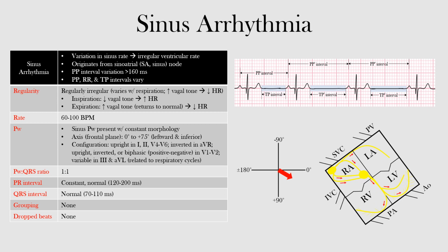conditions. Now, sinus arrhythmia is more common in young, healthy children. The incidence tends to decrease with age, which has been attributed to an age-related decrease in carotid distensibility and baroreceptor reflex sensitivity. So as we've said, this is a normal physiologic phenomenon in which there's that beat to beat variation, okay? And with this beat to beat variation, we can see that the P to P interval, the R to R interval, and the TP interval are going to vary, okay?